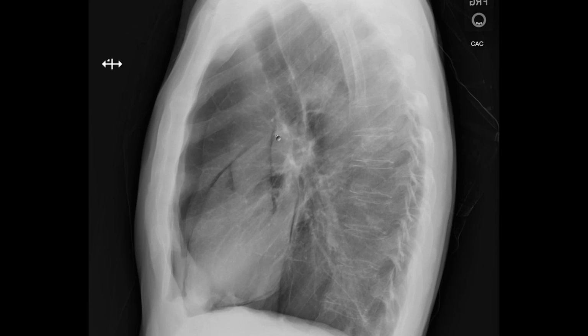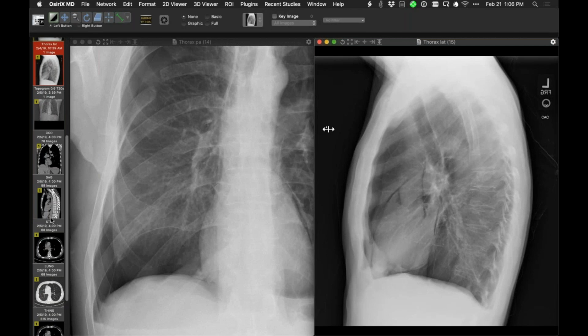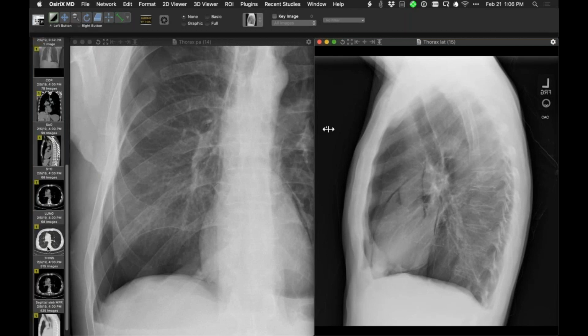And for some reason, when people show cases of Pneumomediastinum on the lateral, they often show the so-called ring around the artery sign in reference to the right pulmonary artery, particularly when there's air around it. Here, there's a bit of air in front of it. But this one's just a nice case because in addition to mediastinal air elsewhere, there's the nice depiction of the anatomy of the ascending aorta because there's air in front and behind it. So just an interesting curiosity, a nice teaching case for Pneumomediastinum.